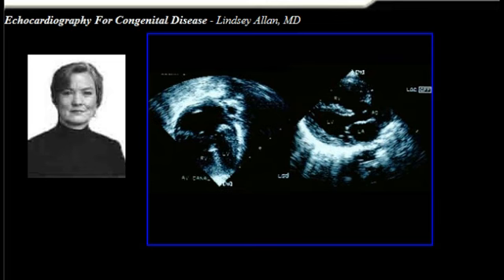And here's an example, a complete atrioventricular septal defect in a 4-month-old child. 2 equal ventricles. There was very little AV valve regurgitation. There's nothing more you need to learn from the cardiac catheterization. So this kind of lesion can be corrected surgically without needing hemodynamic information.